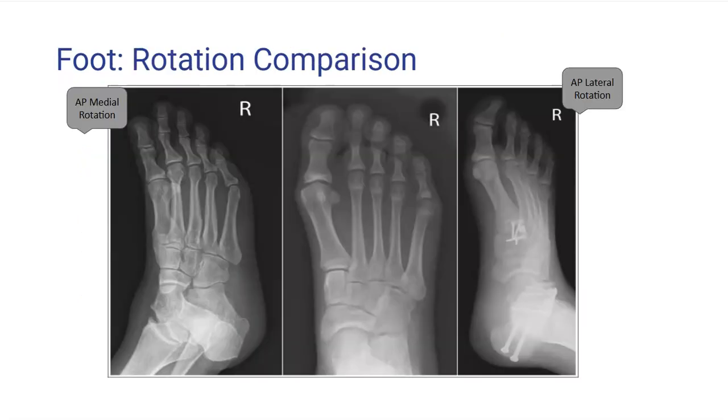In an AP foot projection, proper alignment is crucial to achieving an accurate image. The medial side of the foot generally arches up between the heel and the medial 3 metatarsophalangeal joints, forming a visible longitudinal arch.